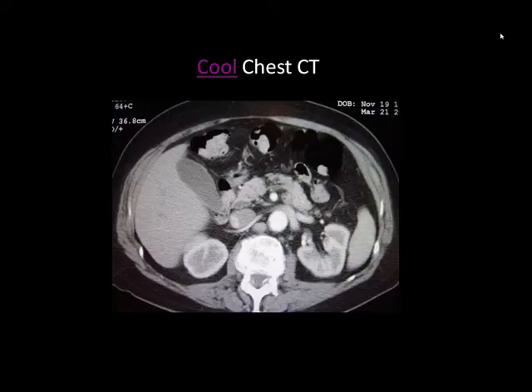Let's go back to our, now this is what your last slice should look like. Here's your kidney, and we know we've gotten through the adrenal glands because we're about halfway through the kidneys. This is the spleen over here. This is the descending aorta. This is the IVC, and this is liver, and this is gallbladder. Here, there's pancreas here, and all this is bowel right in here.